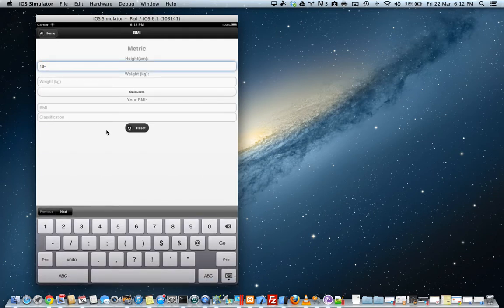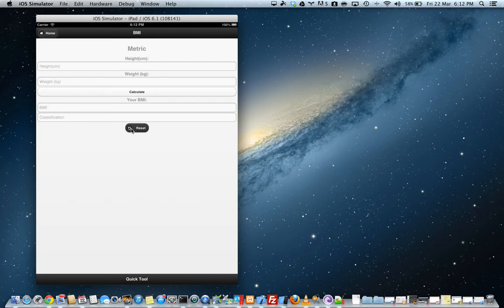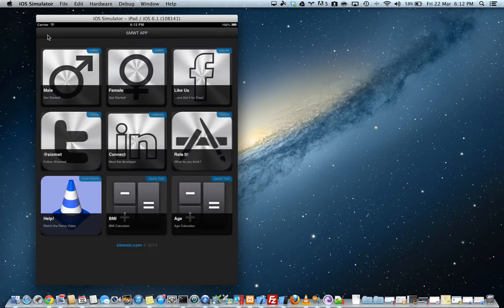180, 90. Let's press calculate, and there you go. Let's reset. Done. Go back home.